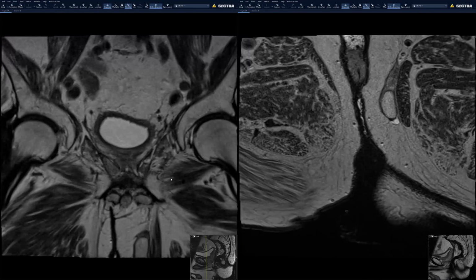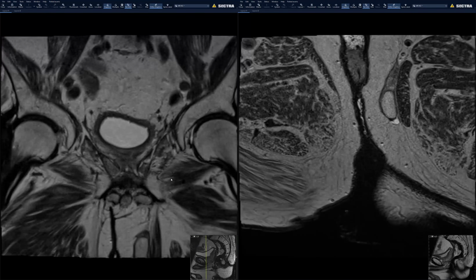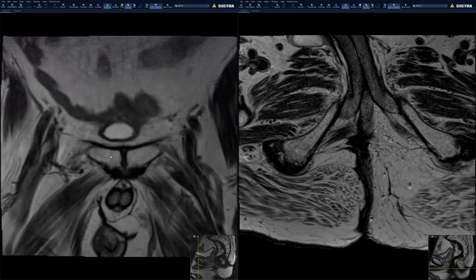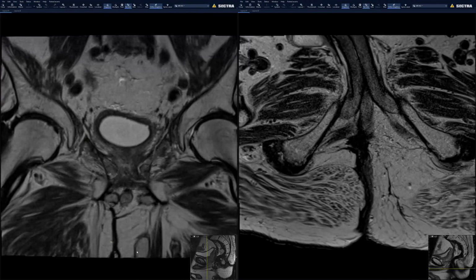You mean the left medial thigh? Mm-hmm. They didn't move their testicle down there, right? They did. So that's what it is. I had not seen it along the medial side there. And on the right side, it is here. Oh yeah, you can follow that. Look at the vessels. It's here on the right side and here on the left.